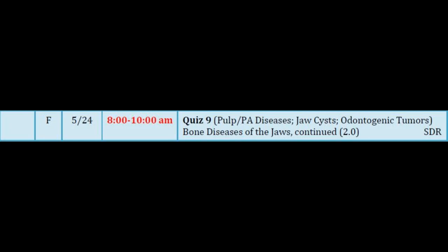So on the left, we have a lateral skull image, I shouldn't say film, because most people don't use real film anymore. Normal skull of a 22-year-old female. You can see the normal skull density. You can see the normal thickness of the cortex of the skull. On the right, we have a patient with Paget disease who is a 49-year-old female. You can see there is distinct thickening of the cortex. It's not densely opaque. It's kind of mixed. And we see clumpy opacity in the wall, in that lateral portion, and areas of expansion, and increased density in the base of the skull, which is where those foramina are as well. So that pattern, that clumpy opacity that we see, that's what we refer to as cotton wool.